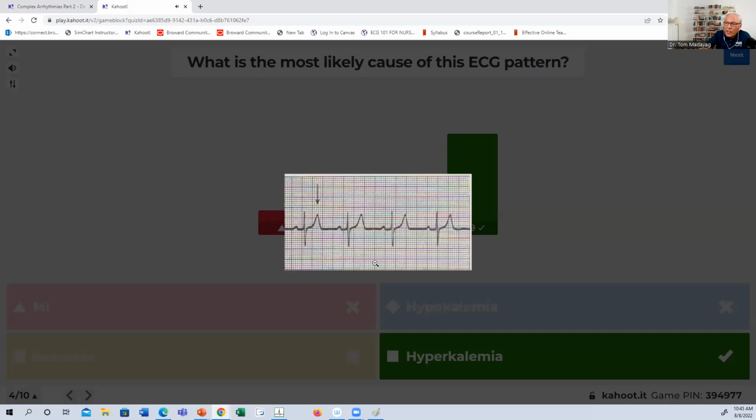Okay, so let's take a look at this ECG. There's something abnormal in the sense that the T wave overpowers the height of the R wave. Remember that a tall T wave is a manifestation of an electrical abnormality, such as hyperkalemia. So let's define what tall is. Normally, the T wave should not exceed 1/2 of the height of the R wave.